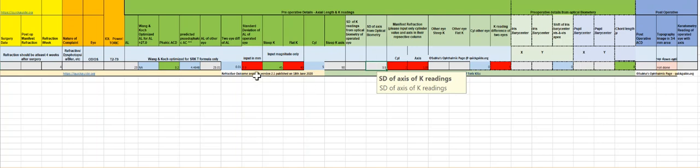So wherever you are going against your average values or the biometry rules, it is going to give you a check mark over here, and you get an indication whether this patient is suited for a premium lens or not. And so I was telling you that you can check the K readings either with the manifest refraction, or you can check it with the other eye K readings also, or both.